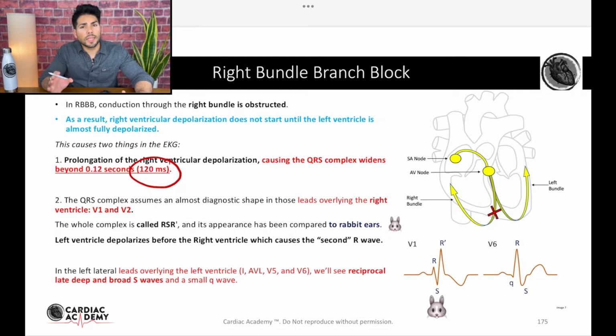Remember that V1 and V2 are right on top of the right portion of the heart. So that's the first place you're going to look, okay? With the right bundle branch block, we have a very specific type of morphology, often compared to rabbit ears or bunny ears, okay? And you can see that right here. You're going to see an R wave, and then an S wave, and then an R prime, okay? And these two R waves are compared to the rabbit ears.